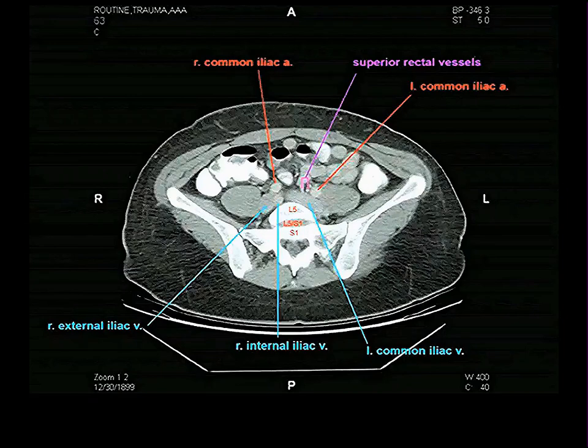And the only reason I did that is because I know what's going to happen later as I go down the series. It is not typical for the internal iliac vein to join that close to the inferior vena cava, but in this particular person it did. And you'll see if we follow it, it's going to end up doing what the left internal iliac does.